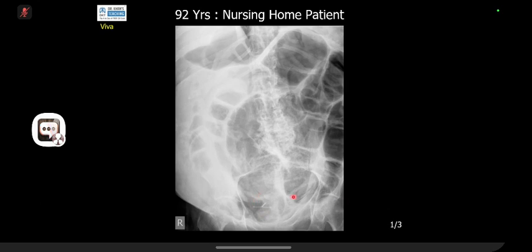You see this thing? So this is the type of patient. Everything is distended. And so please remember, when these patients come to you, the clinical tip is look at the PACS, look at the previous ones, because they will be coming to you for years, right? And with the same thing, distension and that thing.